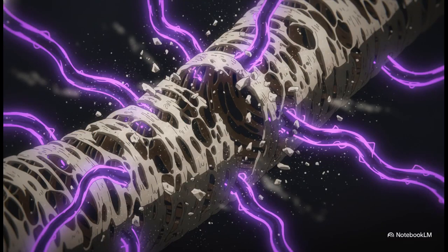And then you have the most aggressive pattern of them all, permeative. These are tiny, ill-defined, almost streak-like holes that make the bone itself look porous. This isn't just a hole in the bone. This is a sign that the tumor is weaving itself through the very fabric of the bone's structure. This is classic for really aggressive cancers, like Ewing's sarcoma or myeloma.